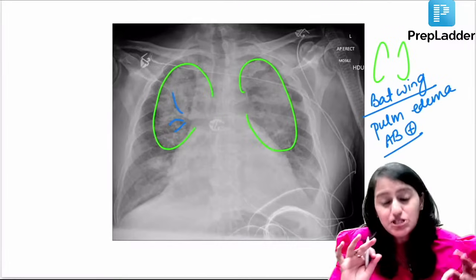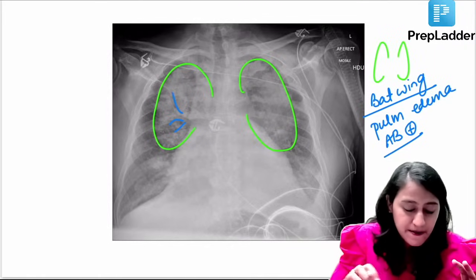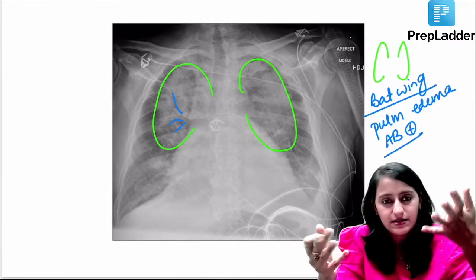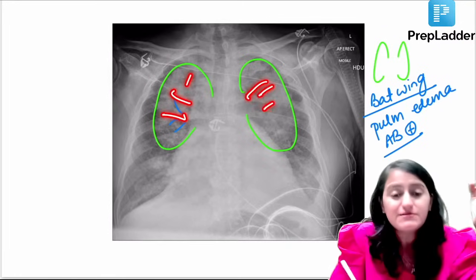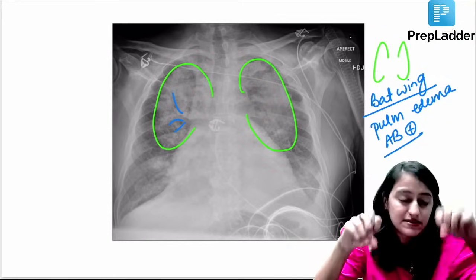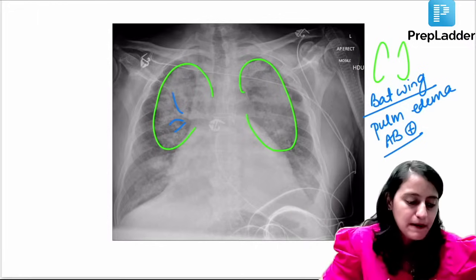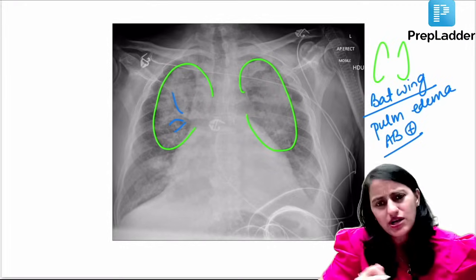So this is not sarcoidosis. Remember, sarcoidosis has hilar lymph nodes, which are outside the lung. You can see the air bronchogram telling you that this lung has become white. This is a lung parenchyma pathology. So pulmonary edema. It could be cardiogenic, non-cardiogenic, right?